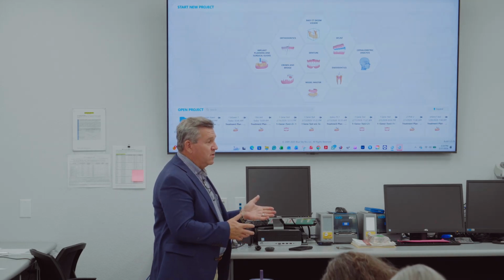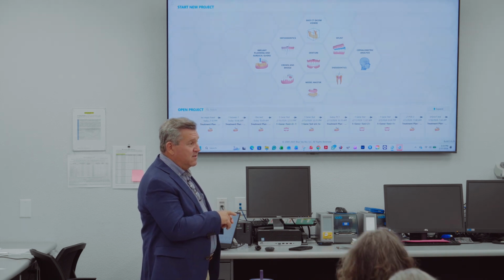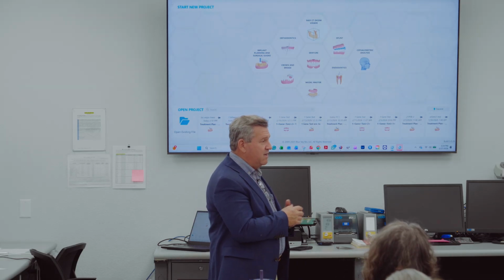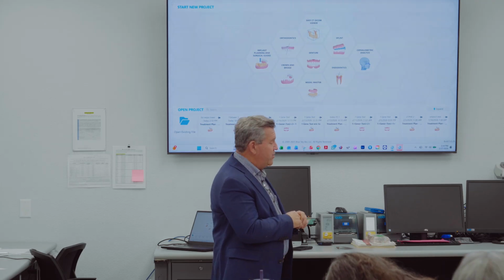Are you guys ready to do another one? There's a maxillary case in there. Let's do that one next. Do you want to walk through it, or do it yourself? You want to see how fast you can get through it? If you have questions, we'll answer them together up here. Should we do it?